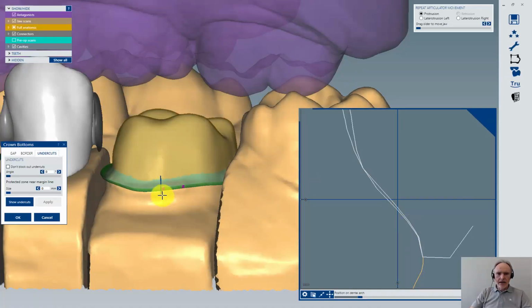We have a small crown here, and we are having a cut here on the margin side, and you can see here that there is a very small gap between the inner and outer side.